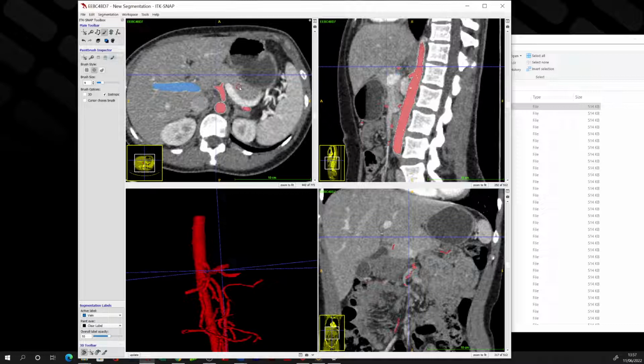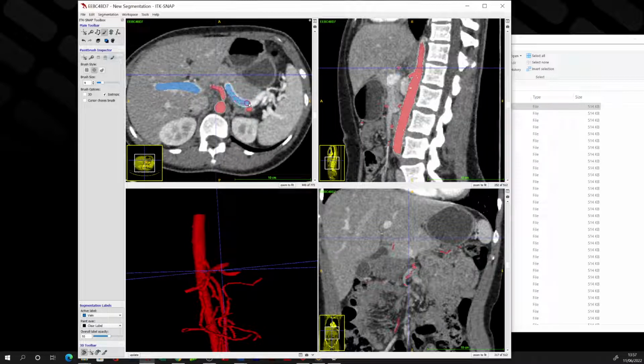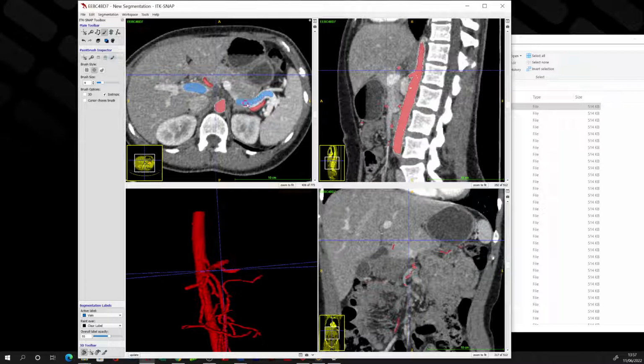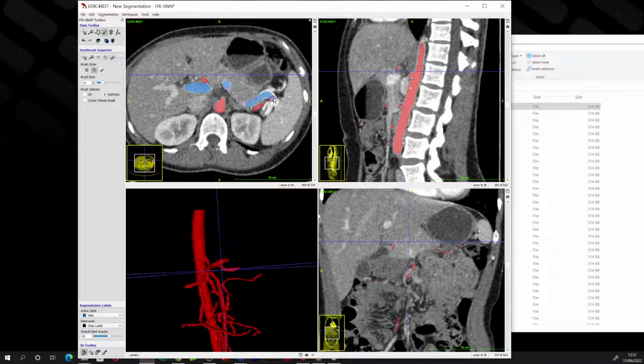I find on the arterial scans it can be very difficult to differentiate the boundaries of the SMV as it courses through the pancreatic tissue. These models are essentially producing a schematic of the actual anatomy. So oftentimes, I wouldn't get too hung up on the absolute boundaries of the vessels.